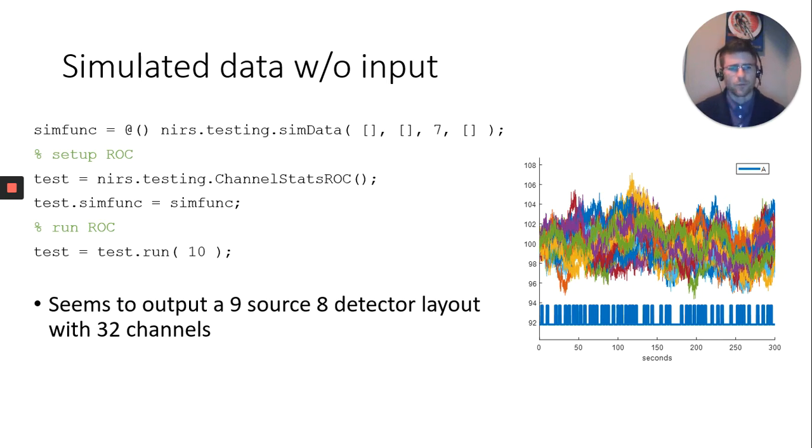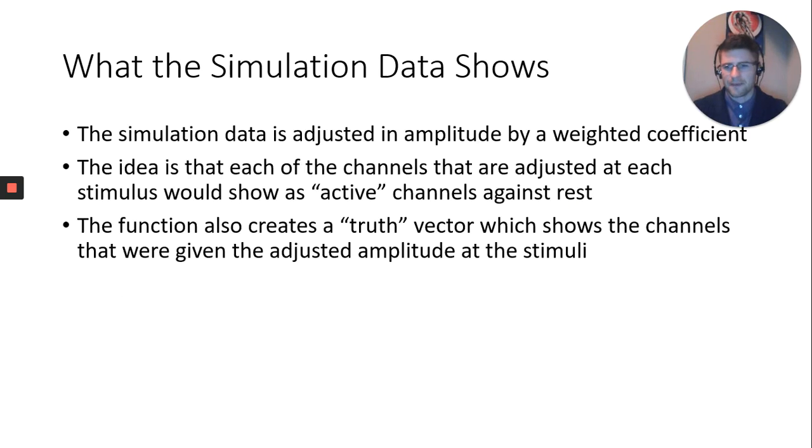Keep in mind, if I have a 20-channel montage and I run 10 iterations, normally you would have, let's say, 20 channels, 1 condition. Normally you'd have 20 t-statistics, right, with 20 p-values. But I have 10 iterations. So once I do 10 iterations, I have 200 t-statistics and associated p-values. So your data will change a little bit based on that. Not the data, but this output will.